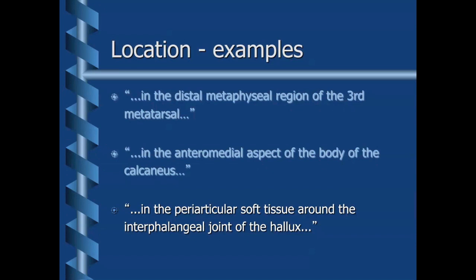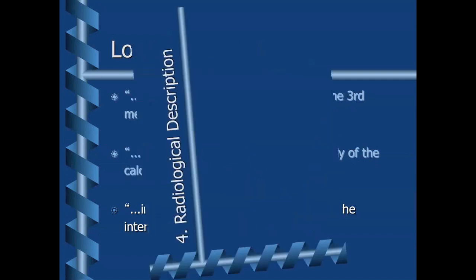So again, if I can bring up the scenario of you being on the phone to a colleague in Perth, then if you were reading this out over the phone, describing the x-rays that were in front of you, your colleague should be able to picture this really, really clearly. And I'm hoping you can see that those three examples provide an exact location for that person, so they should be able to picture that in their mind easily.